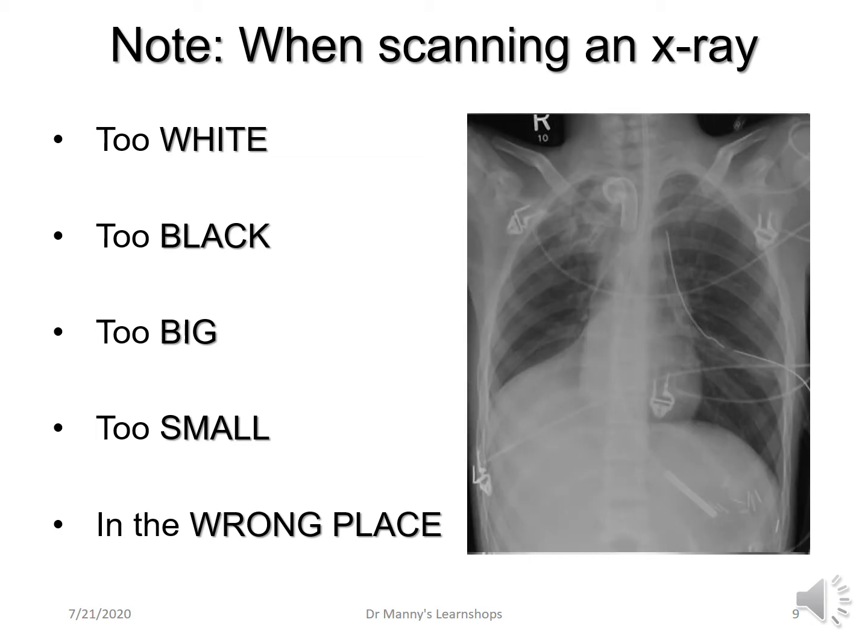Then you can think of, gee, the lungs should be sort of the same, or whatever the intrathoracic structure is, it should be like this. This one, however, on the right side, looks a little bit too small. The right lung looks a little bit too small. You don't know why, but you think it's too small.